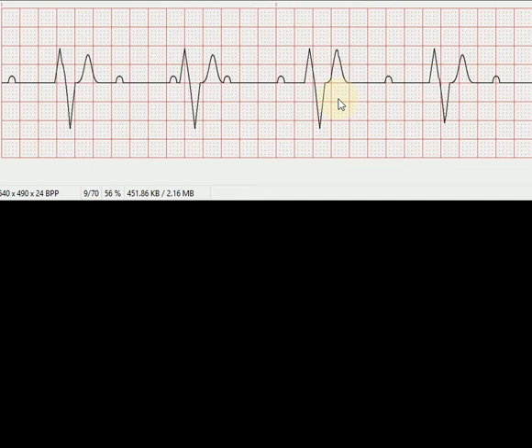Take a look at the chapter that's covering your AV blocks and look at the practice rhythms that are there. What's nice about this is you should be able to analyze most any rhythm in there, and you might find some things where I'm not really sure what that's supposed to mean, because I see some wide and some narrow QRSs on here. We haven't discussed it, but answer as many questions as you can. Just look for patterns, look for consistencies, and you'll find you can answer more questions about this than you can't.